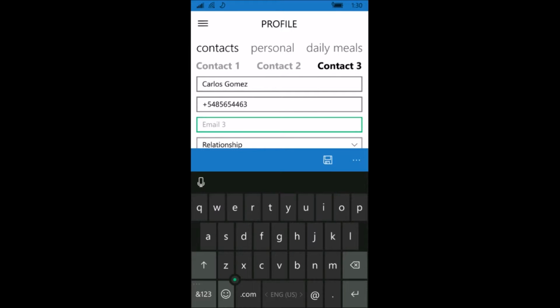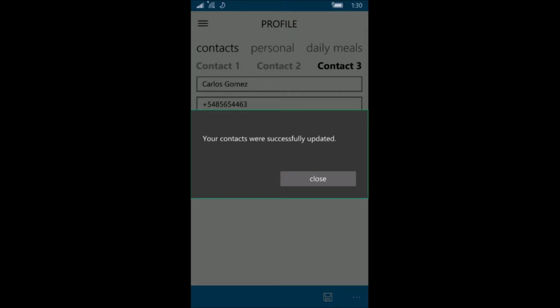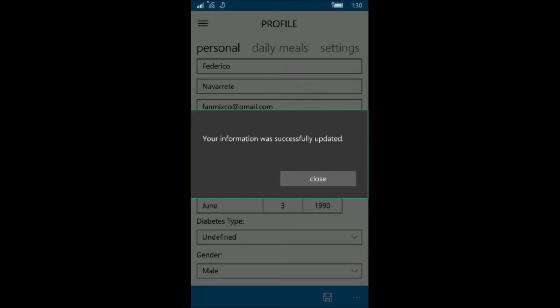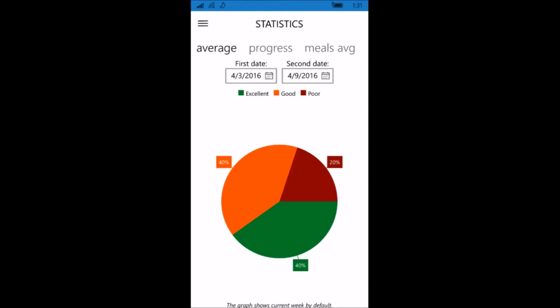Additionally, this information is where you send and share the emails or SMS. You can save your information, and when you save this data, it updates certain things with your database. Later we move to the statistics. As you know, there are three statistics.